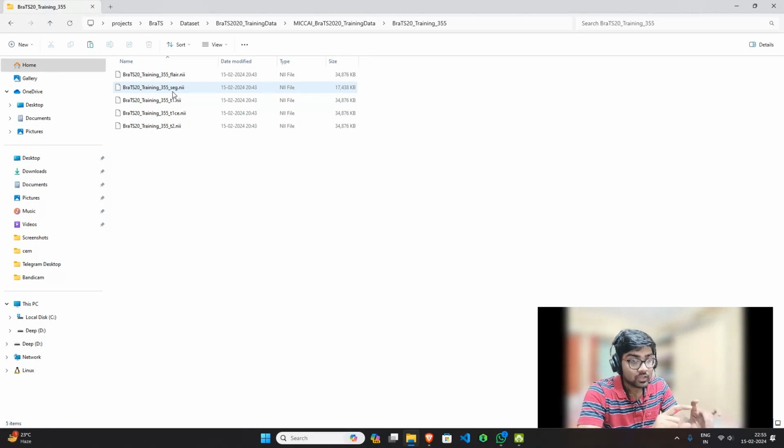Sometimes people ask how to know which modules we have to import. We don't have to know that. While writing the code, we might see that this module might be needed. Then we will go up and import that file. It's not that I know everything we will need in the code and import it all at one time. No, I am importing it step by step. So let's start the coding and we will know how to do it.